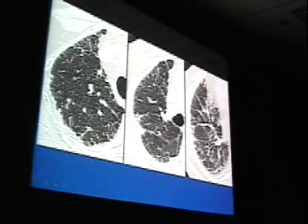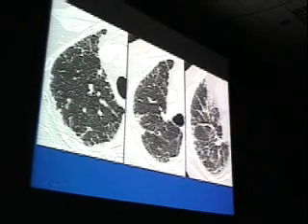Here's another patient where the predominant finding is irregular lines. You can see them here. Some of these are thickened interlobular septa. The predominant ones are thickened intralobular septa. Again here. But notice, as opposed to the patient with sarcoid, the distribution here is predominantly subpleural, involving that peripheral connective tissue compartment. There is some involvement centrally at the bases, as evidenced by traction bronchiectasis, but the predominant abnormality is in the subpleural regions of lung, particularly in the less involved areas.